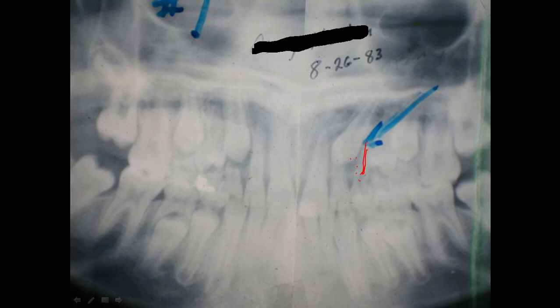But whatever it is, we'll end up taking that out, bringing this back and opening this gap, which you would do normally. And then when you open into this, then this will go away in size, and it ends up being the epithelial tissue around the neck of this cuspid after it gets into the mouth.